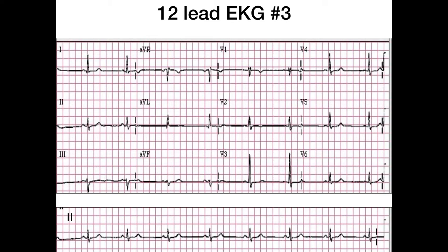Here we go. Let's take a look. The rhythm looks pretty regular to me. Okay. Let's see. P, Q, R, S, T. Doesn't look like there's any differences between those two P waves. We can confirm that with our rhythm strip down here. All right, let's take a look now and do some analyses for our interpretation.